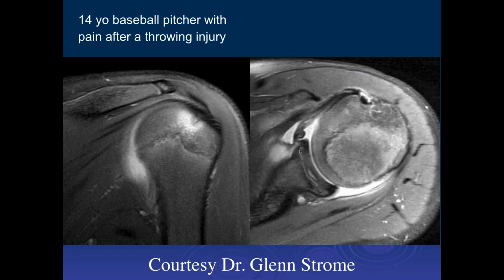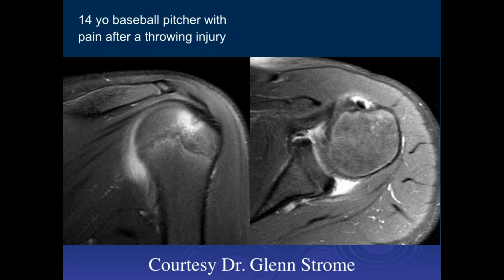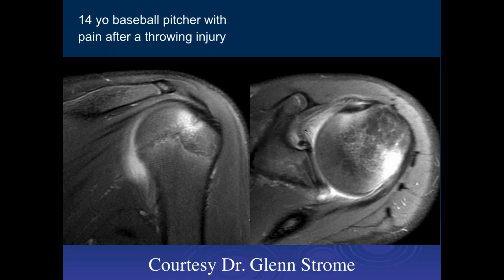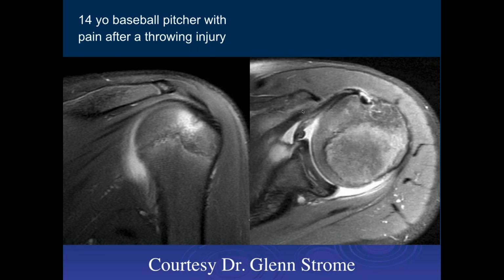Oh, okay. So here we're seeing the biceps long head and again what appears to be a glenohumeral ligament injury. Some of these images, I'm not sure if it's the subscap or the glenohumeral ligament, but there's something injured there. Here's the subscap. Yeah, that looks good there. That looks fine. Here's the subscap. Okay, maybe some volume averaging, but otherwise okay.